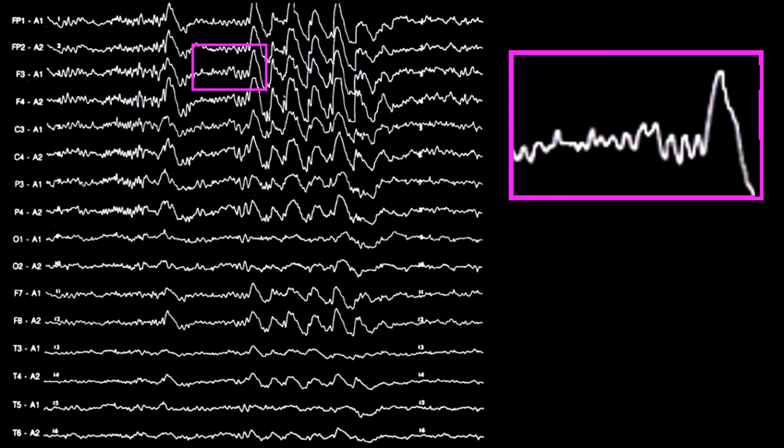I like to take a few seconds to look at this epoch because of how intricate it is, with so many different patterns seen. The one inside the magenta rectangle looks like a mitten because, as you can see, there is a spindle followed by a slow wave. After that, the spindle gets disrupted and only a few waves or a segment of the spindle is seen before each slow wave.